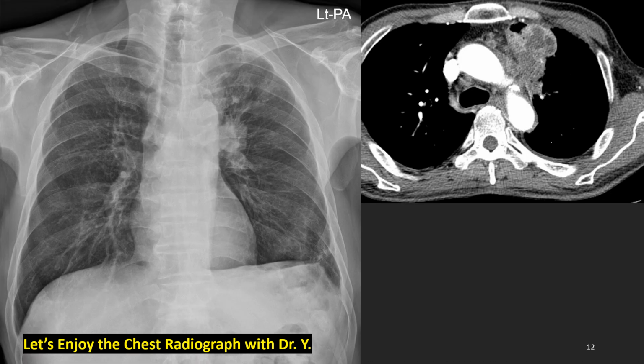Let's look at another case of adenocarcinoma. The left hilum is abnormal, with increased opacity and a deformed shape, the normal pulmonary artery shape is gone, and there is another increased density over here. So these are all masses. And the left diaphragm is elevated, possible phrenic nerve invasion.